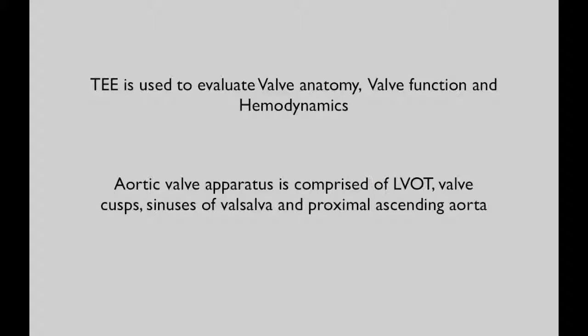So TEE is used to evaluate valve anatomy, valve function, and hemodynamics. So when we think about the aortic valve, we have to evaluate the entire apparatus, which includes the left ventricular outflow tract, the valve cusps, the sinus of Valsalva, and the proximal ascending aorta.